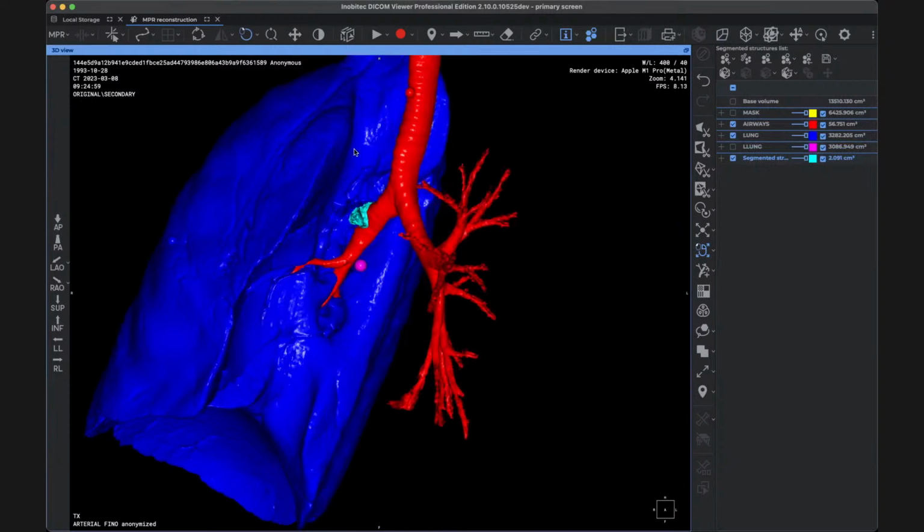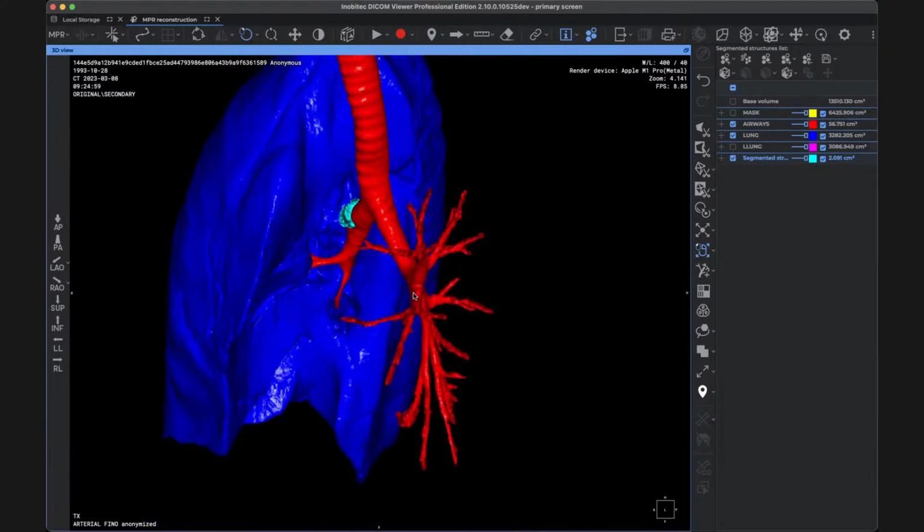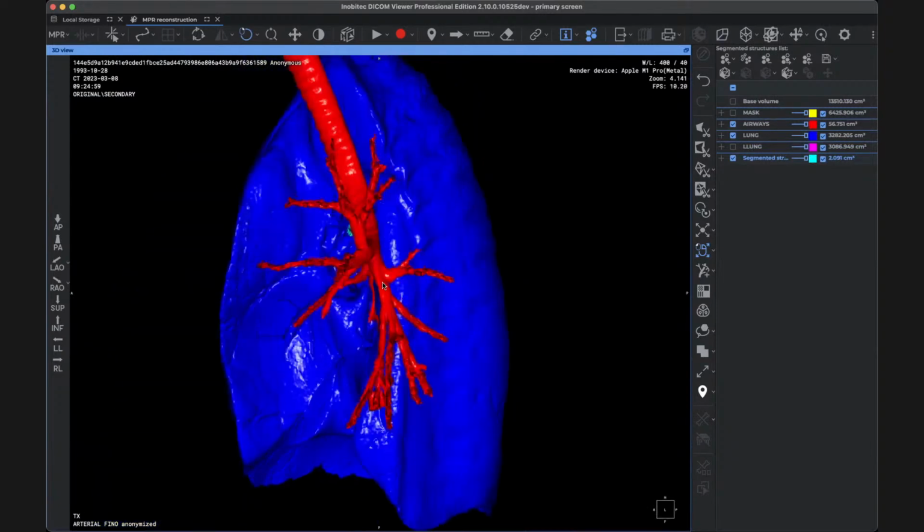You can also show how to hide the markers if they interfere with your picture. Hide structure markers. So we take all those markers out of the 3D view. That's it.